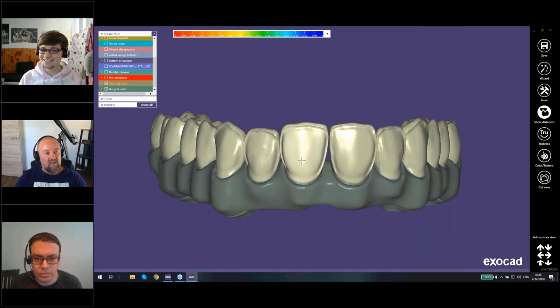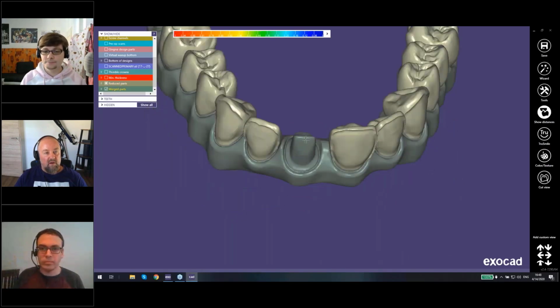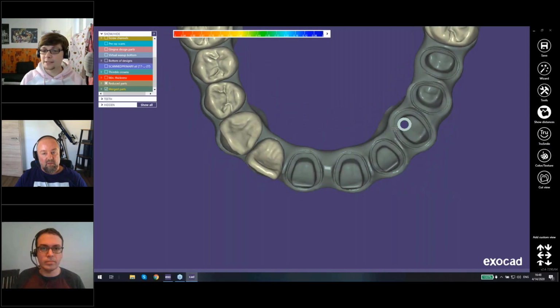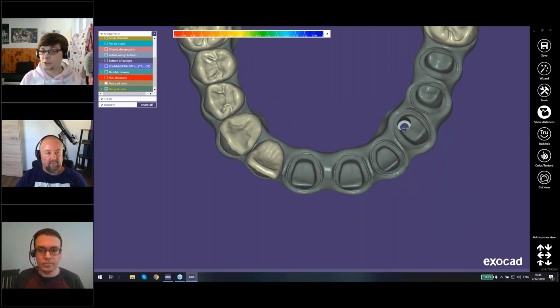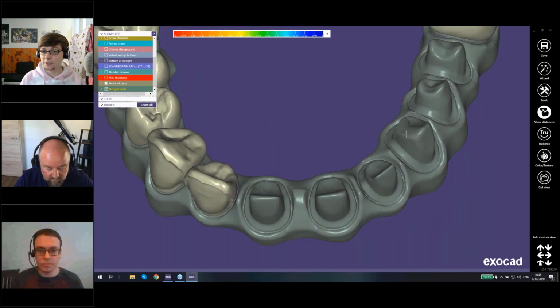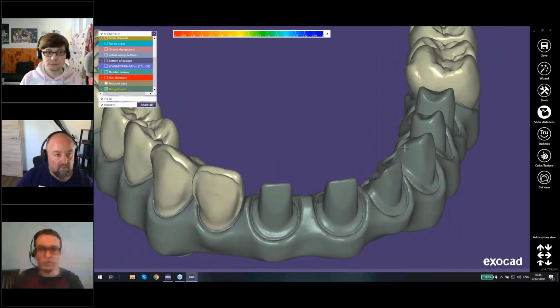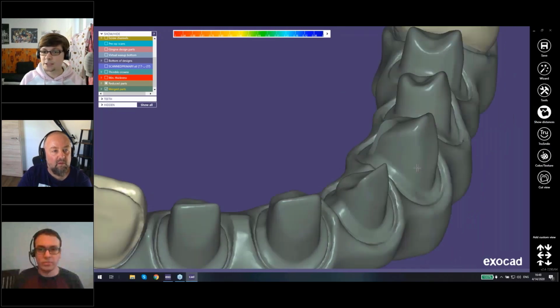There's one question I don't really understand: how to close holes to fabricate crowns. So in the primary part, you don't have to close the hole. If you design the thimble crowns right on top of it, there's no reason to close the holes. The software ignores the hole for the crown on top of it, for lack of better terms.